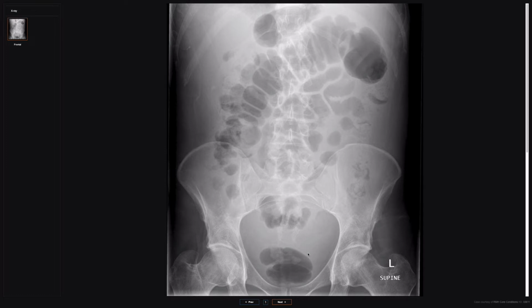So this is a supine radiograph. There's fluid in the abdomen, just like you get with clinical examination, the shifting dullness sign, because the bowel is all floated centrally to the top. You've got the same finding on a radiograph. You've got the bowel loops which are moving in centrally because they're floating on top of the abdominal fluid, and so you see them far away from the edge of the abdomen, and all of this haziness is because of the ascites. Now, obviously this is a much easier diagnosis to make if you have an ultrasound or a CT.